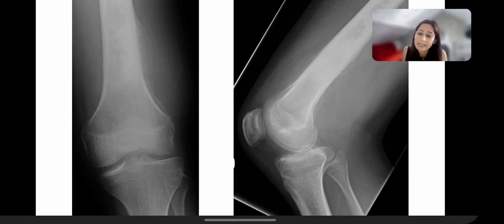There is an ill-defined sclerotic lesion in the distal femur, a multilamellated periosteal reaction, which is interrupted, having a Codman's triangle, some amount of perpendicular periosteal reaction, some osteoid formation, and an extraosseous component. Now this is osteosarcoma, right? At the top of the differential list, you have osteosarcoma.